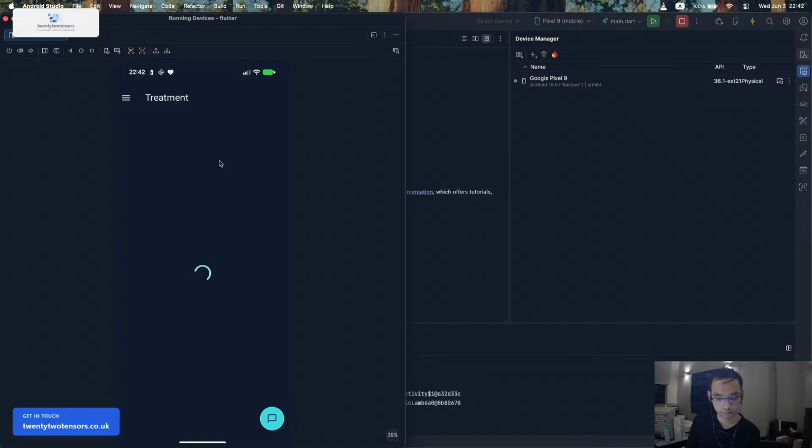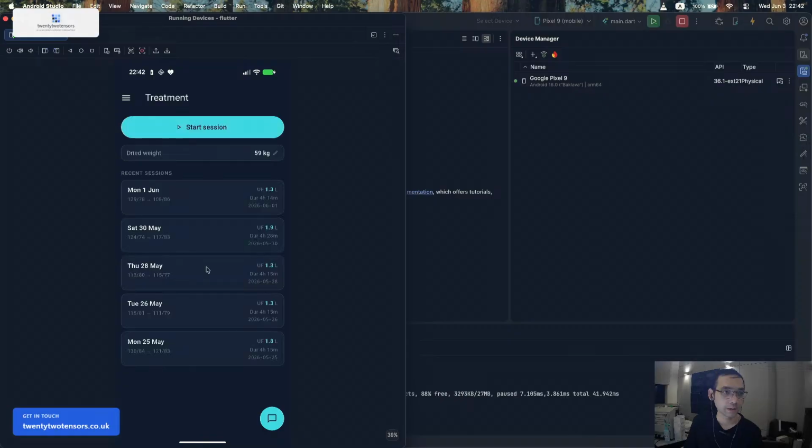So this is my app. This is my app. So basically it will have four main functions.